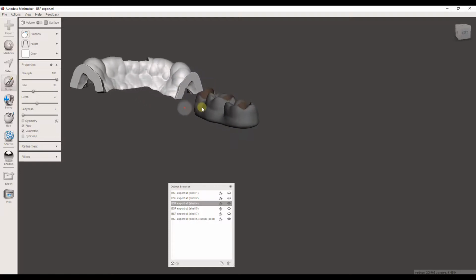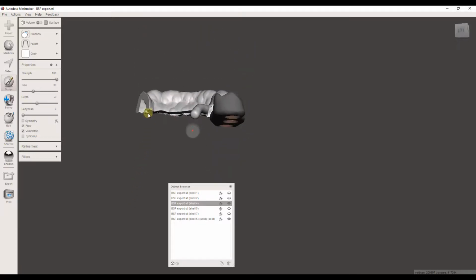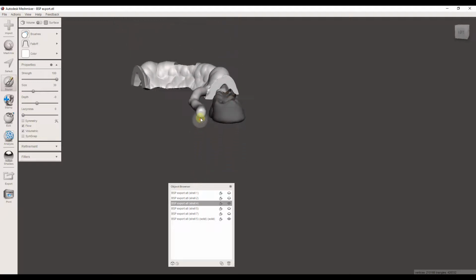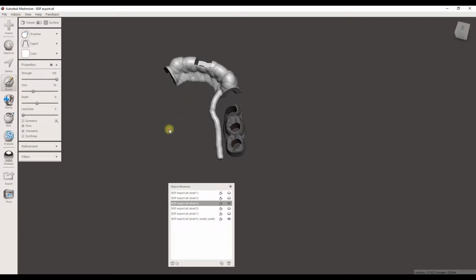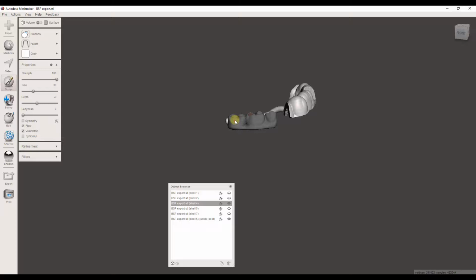And so what I'm going to do is on the side, using the inflate, I'm going to draw this thing coming at me and get down to the level of where the teeth are, where the prosthesis is, and it's always drawing towards me in the screen. So I keep adjusting to look at it and see where I am. Let me go a little more here. Yeah, we'll stop there.